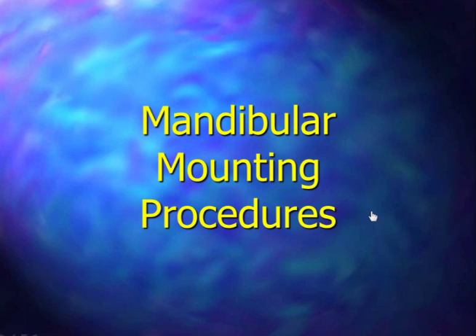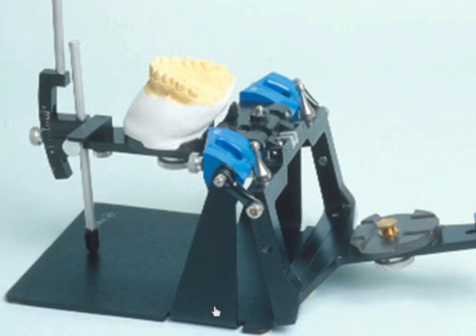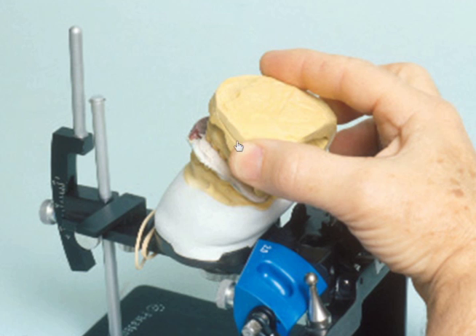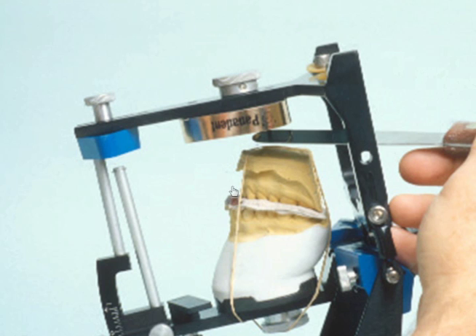When we go to mount the lower cast in the laboratory, we have a mandibular mounting stand here which helps support the articulator upside down. We have the upper cast in here where we'll add our centric relation record to the upper cast. Then we'll add our lower cast to the centric relation record. Then we can close the lower frame around until it touches the incisal pin to see how much plaster we need to make a connection of the lower cast to the mounting plate.